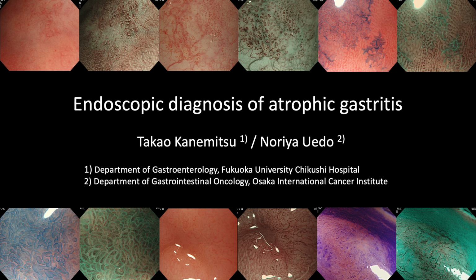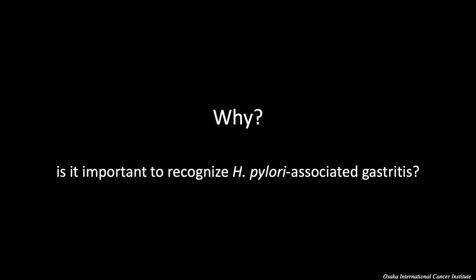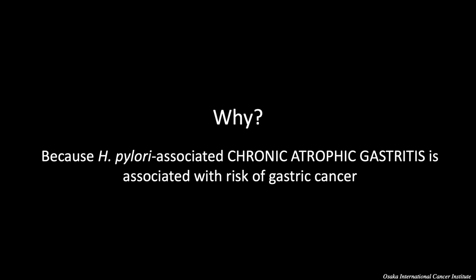Today, I will outline the endoscopic diagnosis of atrophic gastritis. Why is it important to recognize H. pylori-associated gastritis? Because H. pylori-associated chronic atrophic gastritis is associated with risk of gastric cancer.